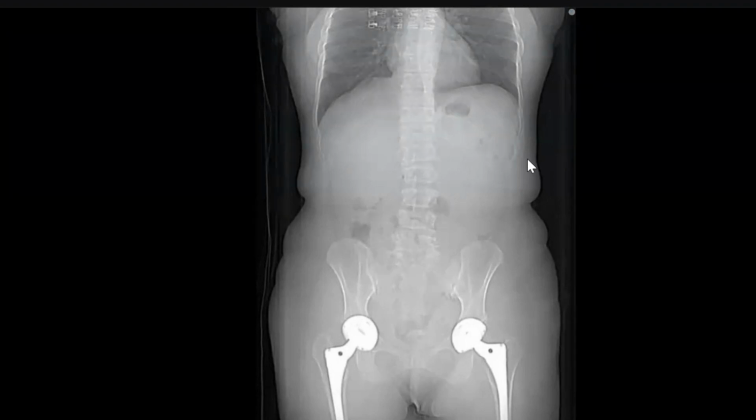Second, I can see that both sacroiliac joints appear clear. Are you sure there is no obvious abnormality within the spine? Tell me. Maybe there is a lytic lesion within the left iliac bone. I cannot see the border of the left sacral bone clearly.